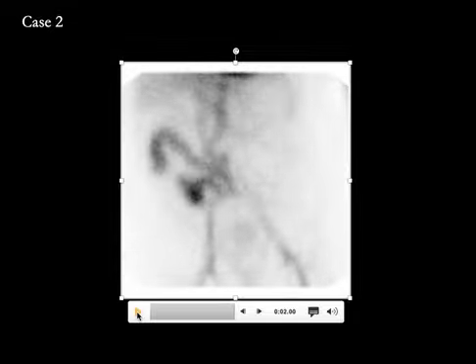So the abnormal focus appears here at the splenic flexure of the colon, and the intraluminal blood, since it's an irritant, can go antegrade in the bowel and it can go retrograde in the bowel. And here we see retrograde passage of the blood, which goes from the splenic flexure back into the redundant transverse colon and then into the hepatic flexure of the colon and into the cecum. So the site of bleeding is here in the watershed region in the left upper quadrant at the splenic flexure of the colon.